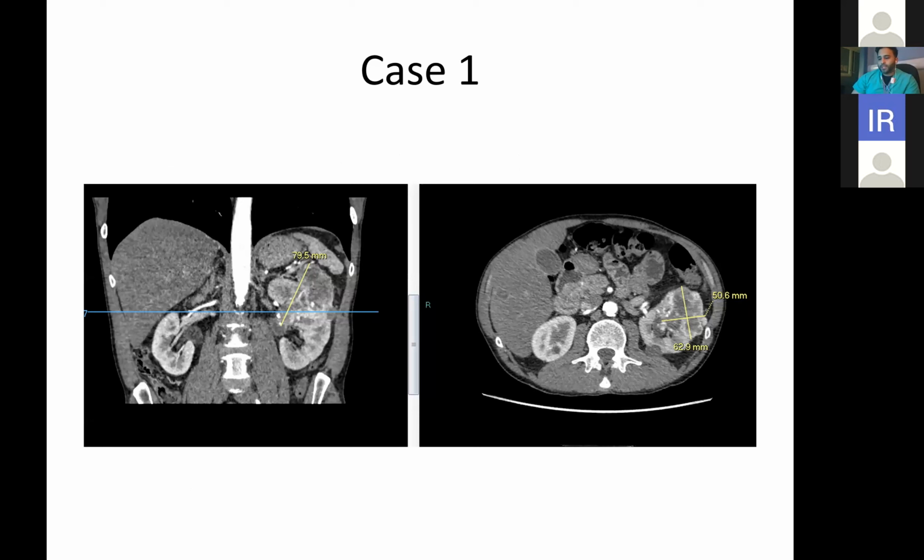So you look at the CT, a CT's been done with a view of looking at the kidneys and obviously the abdomen and pelvis, and we've obtained the CT in different phases. And you can appreciate that the CT in front of you is an arterial phase study. You'll also appreciate that there's quite a sizable lesion situated on the left-hand side, arising from the left kidney. You'll notice that it is quite heterogeneous in its appearance.